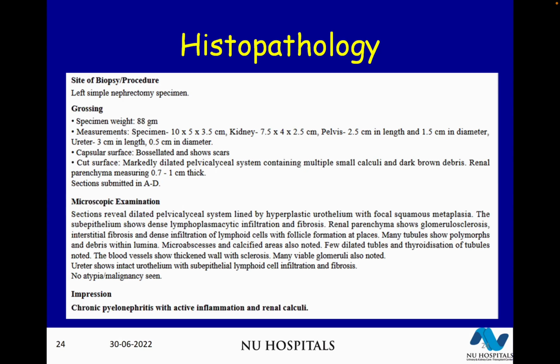You see the artery, there is no stenosis here. So there is no point in doing all these fancy tests. Okay. Kidney got what it deserved, finally.